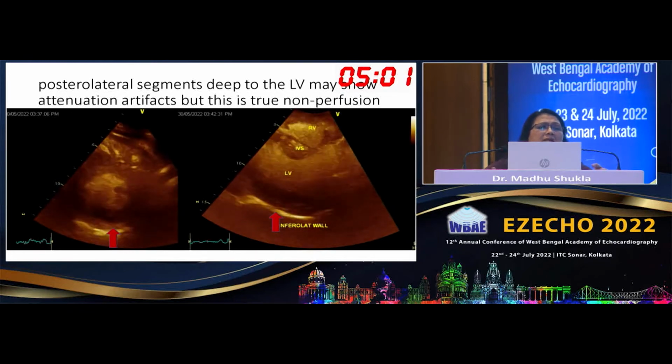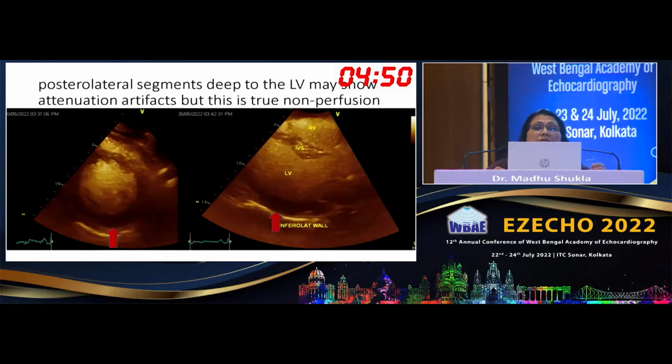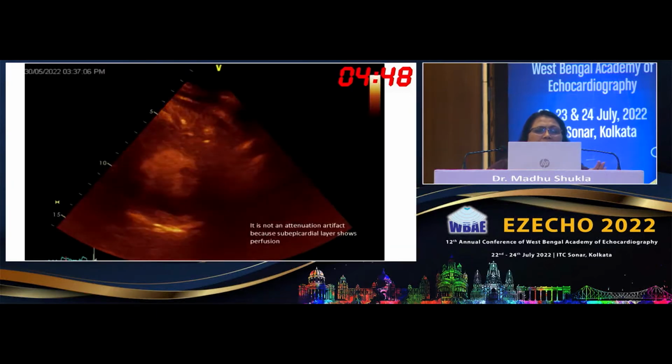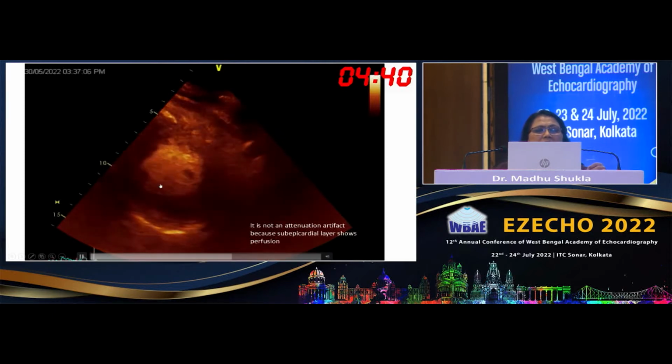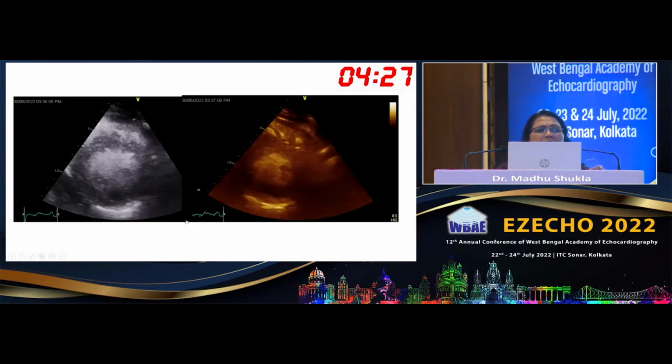But now the question can arise that it can be an artifact. Posterolateral segment deep to the LV may show attenuation artifact, but this is true non-perfusion. We'll show you. See, it is not an attenuation artifact because the subepicardial layer shows perfusion. You can see here. And these are other views to show. This is a left side still image and right side moving image.